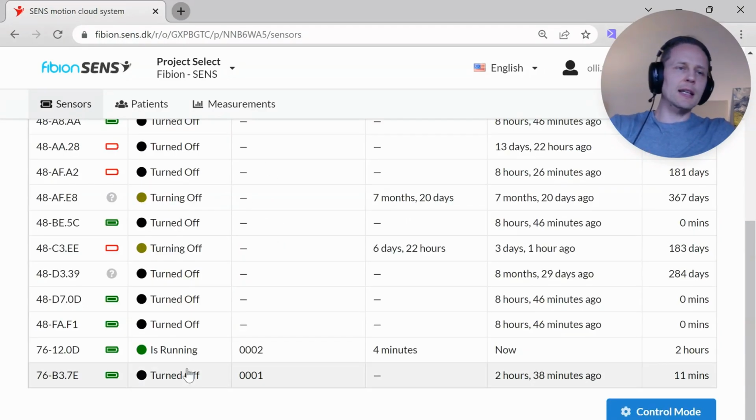So basically now I showed how to check that a certain sensor has data. If you have more than one sensor measuring, like normally you would have in a project, you could check at certain times. If you are the project leader and you, for example, have research assistants, you could ask them every 3 days to go and check that all the sensors are collecting data. Basically, they are collecting data because participants cannot stop them. So if you have checked it 3 days ago and it was collecting data, it will be collecting.